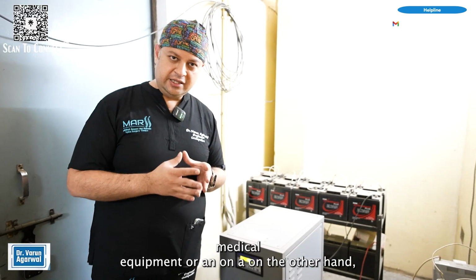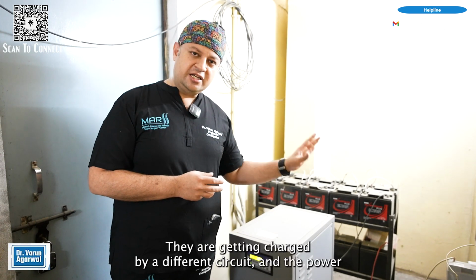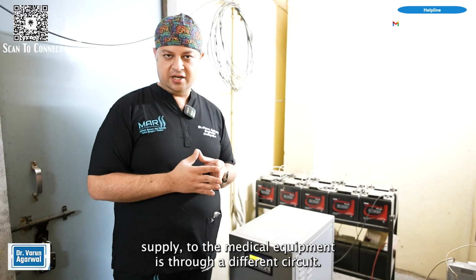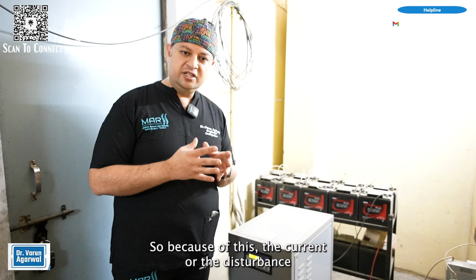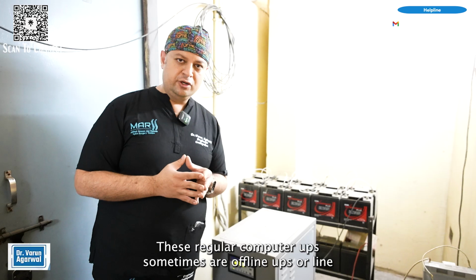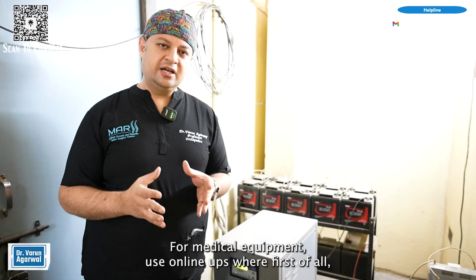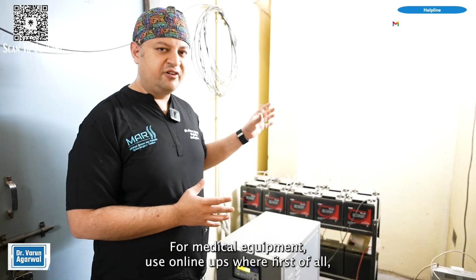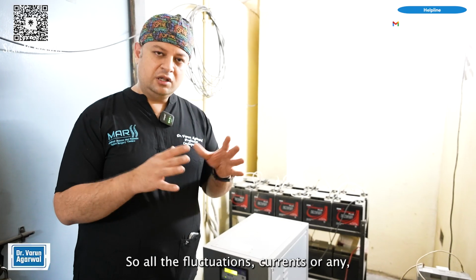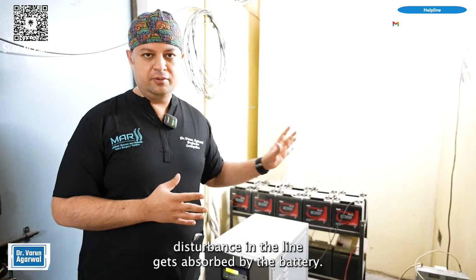On the other hand, in an offline UPS, the power supply is bypassed by the batteries. They are getting charged by a different circuit, and the power supply to the medical equipment is through a different circuit. So because of this, the current or the disturbance or any fluctuation can bypass the UPS and damage your equipment. These regular computer UPS sometimes are offline UPS or line interactive UPS, and you should be aware of this fact. For medical equipment, use online UPS, where first of all the battery is charged, and then from this battery the medical equipment gets powered. So all the fluctuations, currents, or any disturbance in the line gets absorbed by the battery.